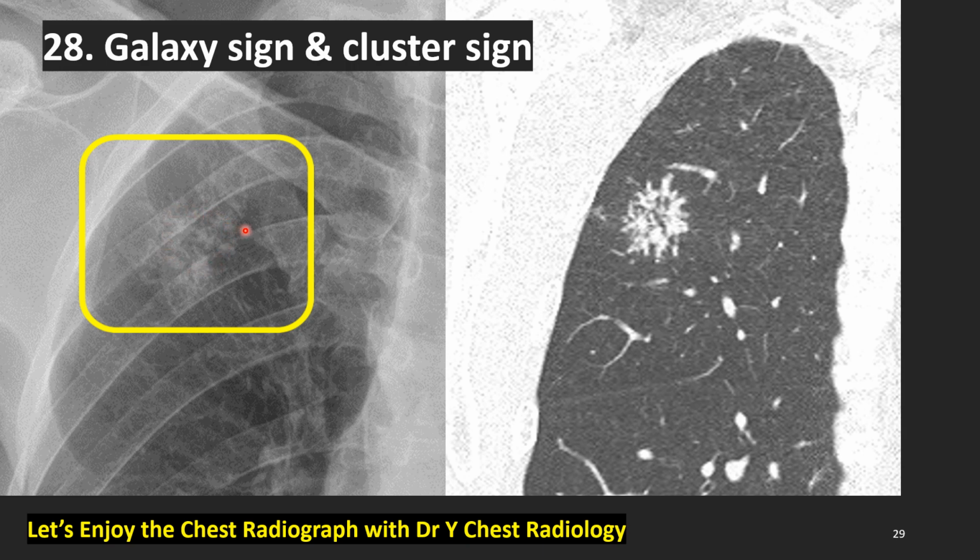But after that, many other doctors continuously found the same findings on the tuberculosis, silicosis, even in progressive massive fibrosis.